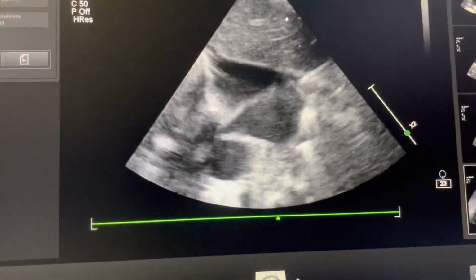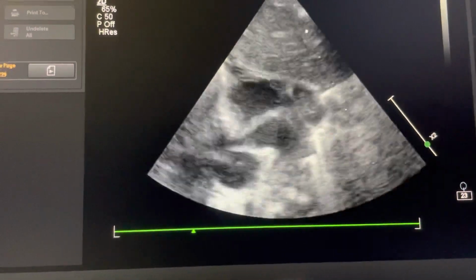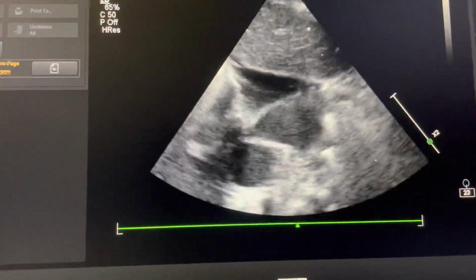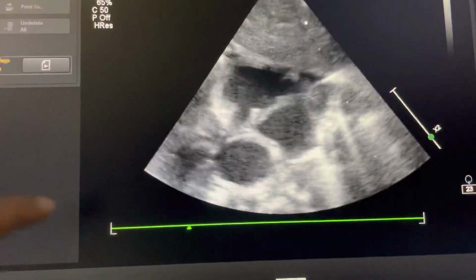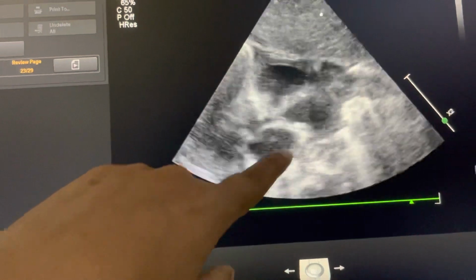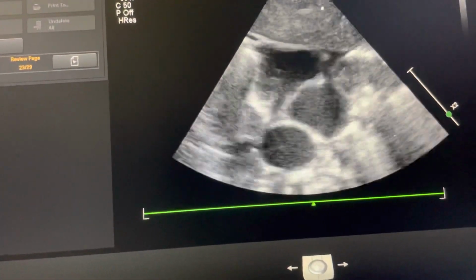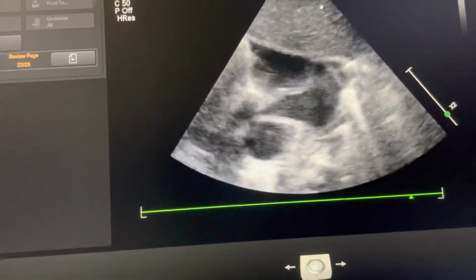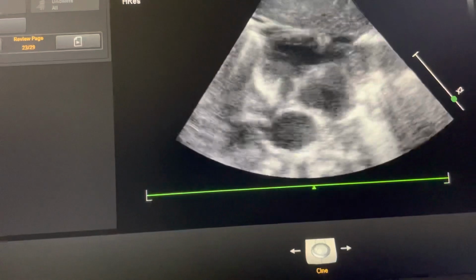In this image also, what you see, a structure that is in cross section. You see right atrium, left atrium, and this is the hugely dilated right pulmonary artery. A structure that is just behind the superior vena cava in cross section.